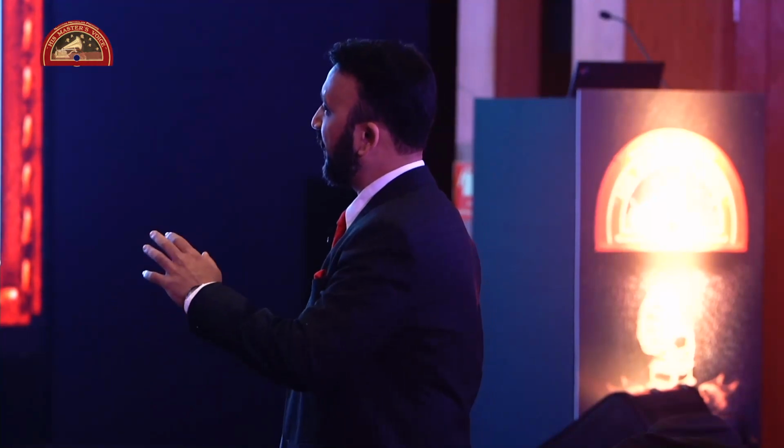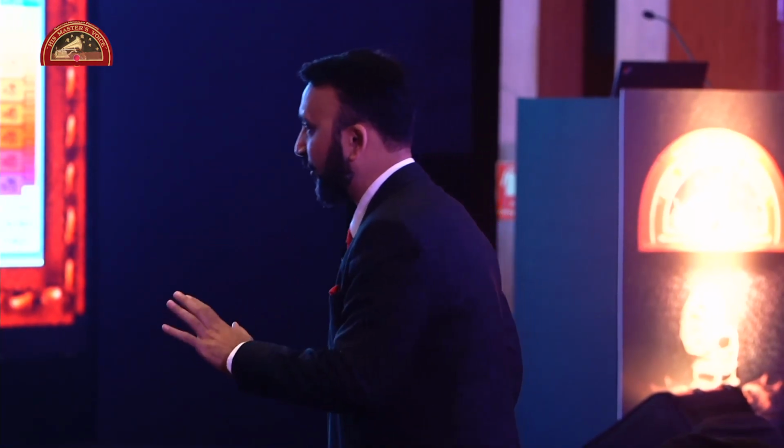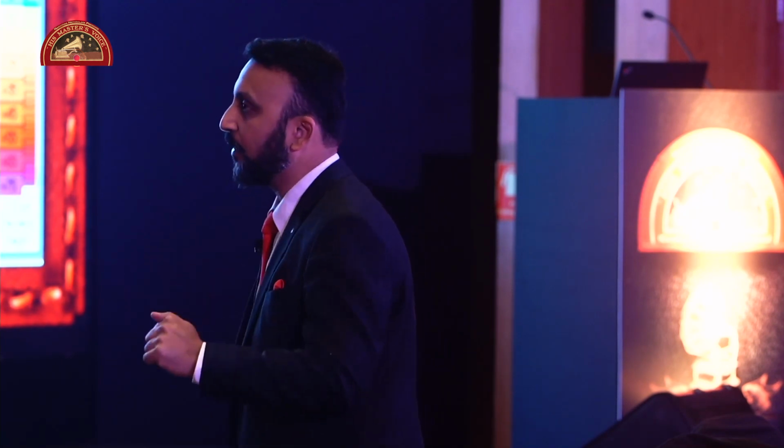And Dr. Ron, please. How dark does it have to be? Are you talking pitch black or a little light? I don't think so. Even if there is a light, you still would be able to acquire the scan. It's absolutely fine. It's not as bad as we think.